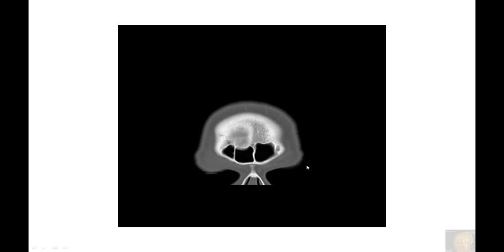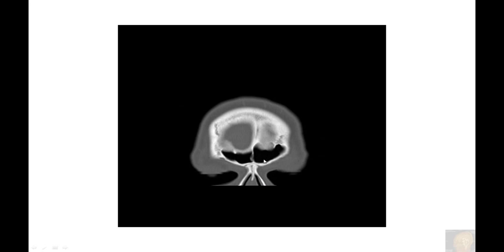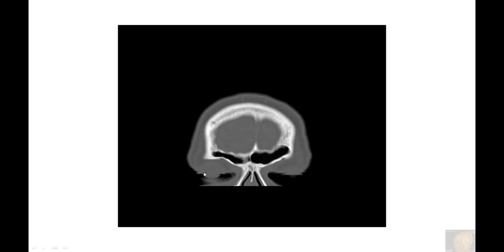So here I'm in the front of the brain, barely covering the nose. I'm scrolling backwards towards the back of the head, and here I'm seeing the nasal bone that sometimes gets fractured because of this quite protruding structure in the face that frequently gets injured. Here are the frontal sinuses and the bilateral eyeballs, and here is the space for the brain.